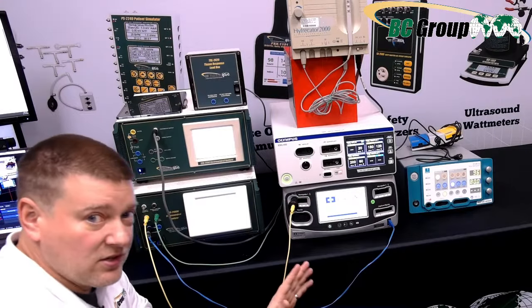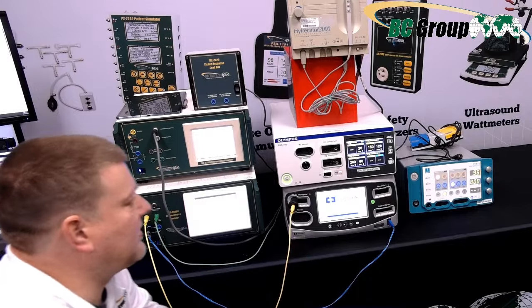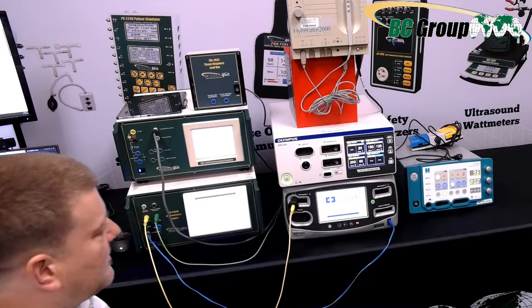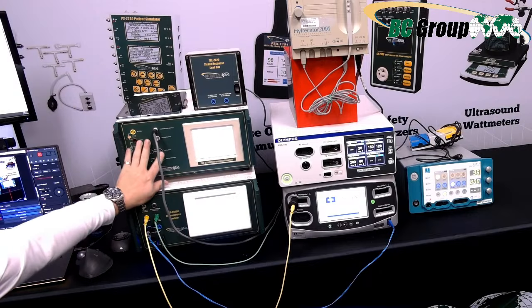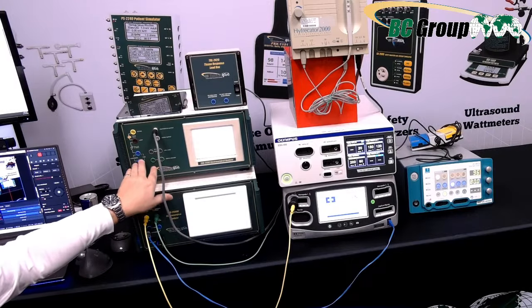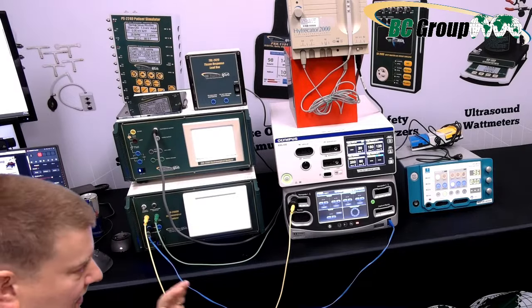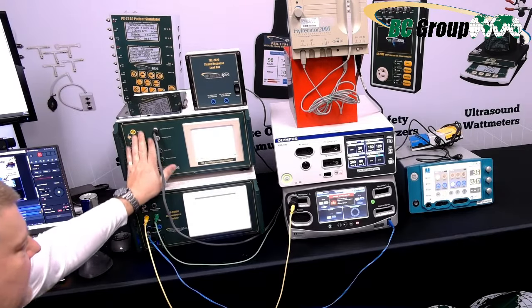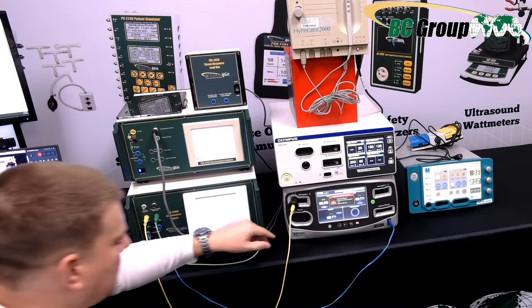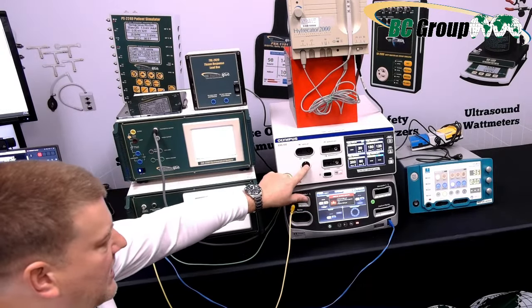We're not going to be actually doing PMs, guys. We're doing an operational overview of the technology. I'm going to show you guys how to take measurements, and then we're going to go into the menus because a lot of people are confused about what a lot of these plugs are for on the front. And there is, God, I hate those ESUs. There is a functional reason for all these different types of plugs. We're going to go over them, okay? I cannot tell you about the universal plug on the front of this guy here.